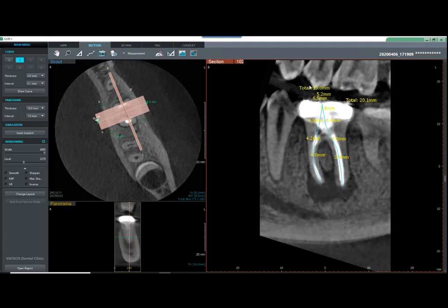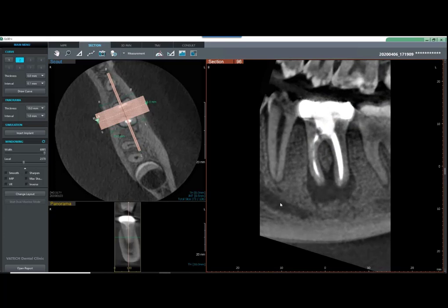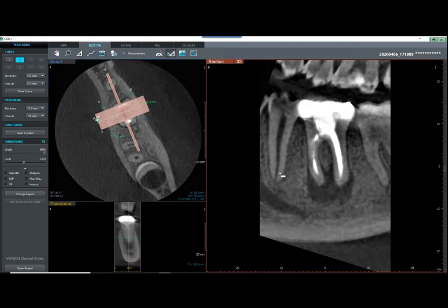Double click, and there's going to be our working length there. Other options, scroll. Let's look at our next tooth there. Let's go to draw, and you can see this a little bit better away from that gutta percha there. Just kind of click through that, and we can double click here, and there's our total working length.